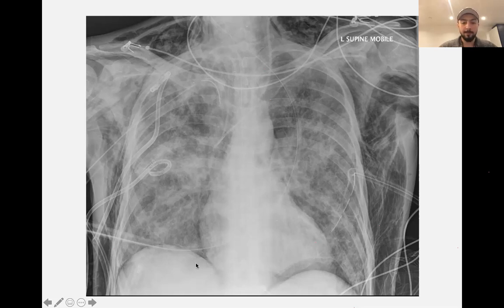Okay. You can see the heart in here. It's less than 50% of the cardiothoracic diameter. You can see the costophrenic angles on here as well. And well, everything else is not really normal. So you can say there's some drains in here. You can maybe even see some ECG conductors in here. So you can comment on these things as part of your E.